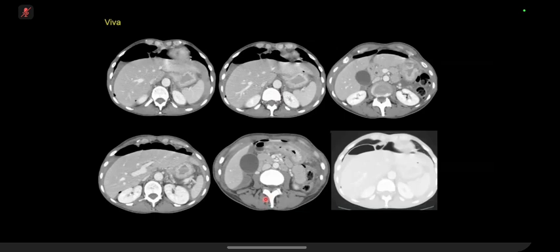These are selected axial cuts from a contrast-enhanced CT of the abdomen, and there's one with lung windows. There seems to be gastric wall thickening with increased attenuation consistent with enhancement in the region of the mucosal side of the surface, surrounding some fluid that's within the stomach. For example, in the upper right image.